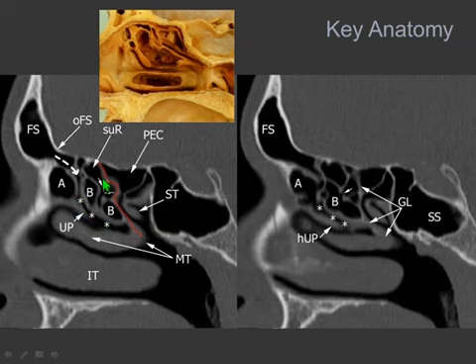In front of this complex is another small complex that in simple conditions is made up of a single cell, which is called the agger nasi cell, meaning the first and large ethmoid cell located immediately in the first slices you have when you reconstruct in the coronal plane.